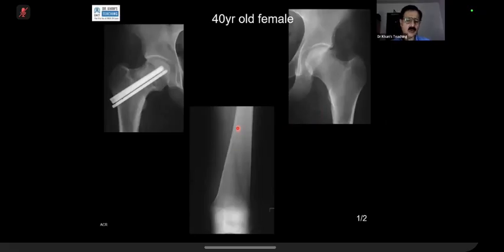Okay, now what kind of femur is this? Describe this. What word will you use for this femur? Shape of femur. The shape of the femur looks like Erlenmeyer-flask deformity. Excellent. Now, this case I'm just showing you for the sake of differential.